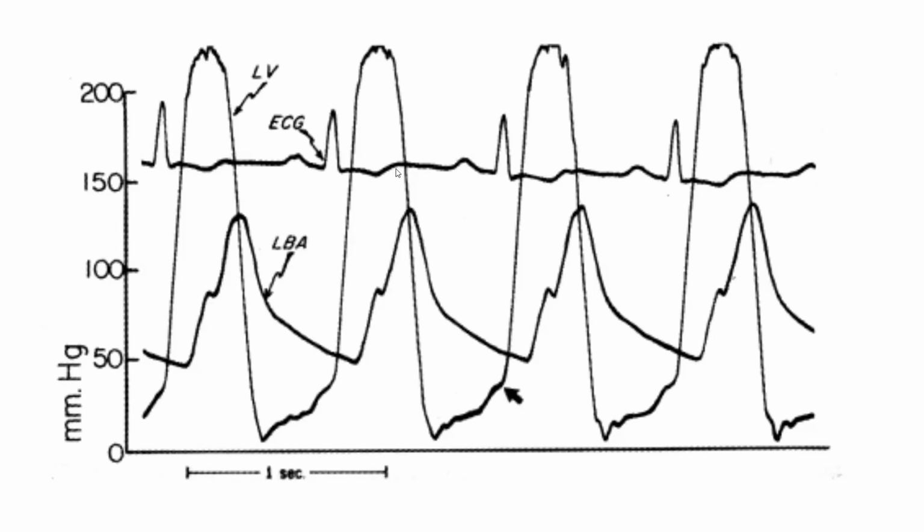So here is the answer. Let's analyze systole and diastole. In systole, there is a big gradient between the brachial artery and the LV. It's a huge gradient of over 80 millimeters of mercury, very suggestive of aortic stenosis.